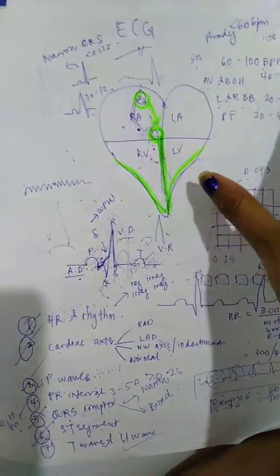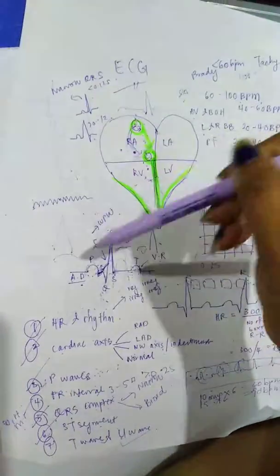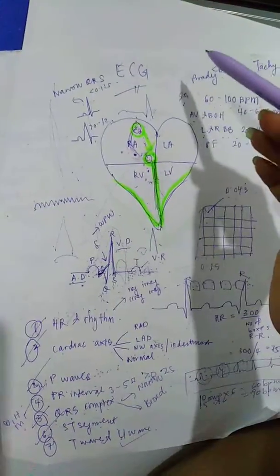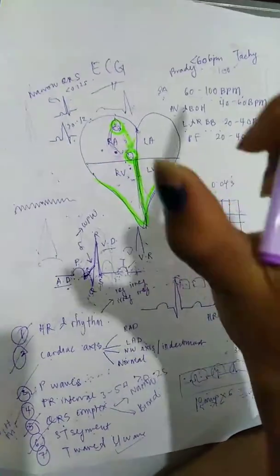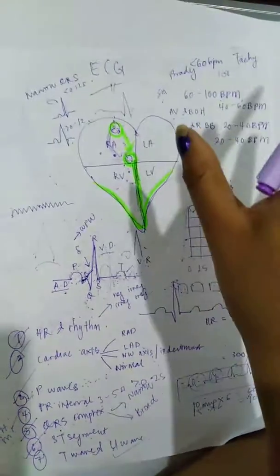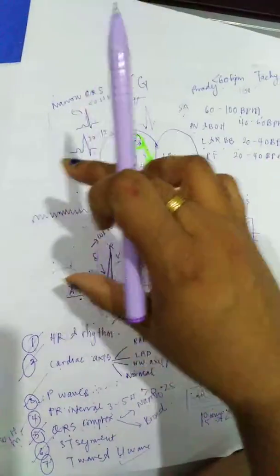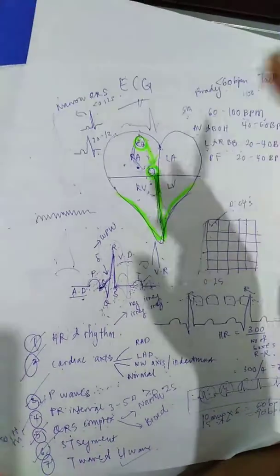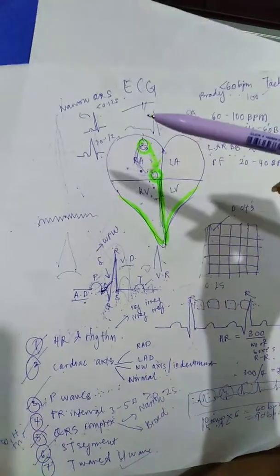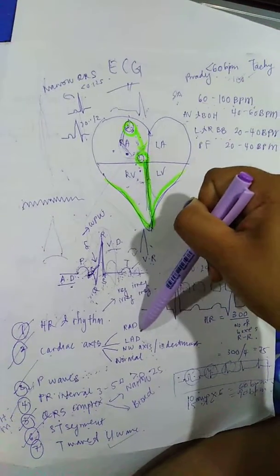And this U wave is also associated with specific metabolic abnormalities. Basically you can see classical U waves in an electrolyte imbalance, or sometimes even hypothermia, or when you give the patient too much anti-arrhythmic therapy such as digoxin, procainamide or amiodarone. You can even see this U wave having a deflection of more than 0.5 mm after the T wave. So this is the presence of the U wave. However, this U wave is not a common finding that you can see in an ECG.